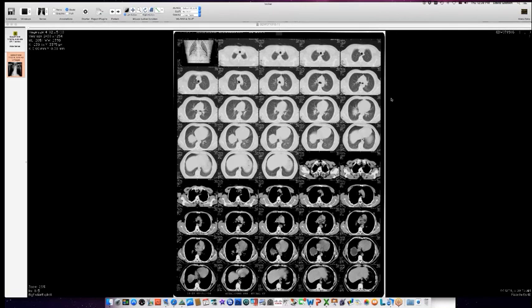These are 3 cases from a visiting Persian radiologist who brought these for our teaching case, and these are all occupational. So this person was a sheep herder, and you can see on the scout view that there's a smooth, round lesion in the right base. In the second to the bottom row, we can see this fluid-filled lesion adjacent to the diaphragm and liver, and nothing that remarkable about the internal characteristics. It does have a little bit of thickening of the wall, but I don't see any membranes floating in there. But this is hydatid disease from sheep herding. So that's one occupational case.